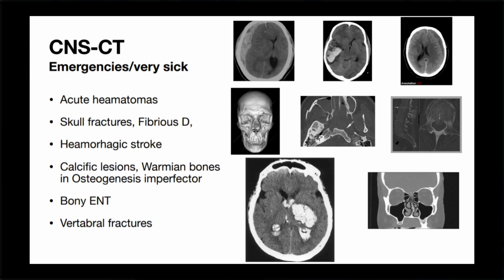You have again acute hematoma, and the management of these infarcts differs. Either it is ischemic or hemorrhagic. Now, for the hemorrhagic infarction, you will need a CT scan because it not only demonstrates the acute hemorrhage, but it also shows you other complications, like if you get intraventricular hemorrhage, like you see in that image.